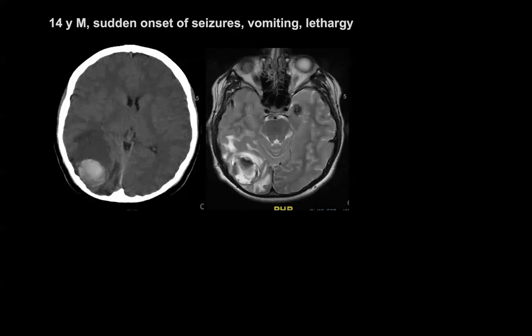Why is that and what should we do? Basically, there are two areas of susceptibility. One is a big hematoma. This is probably a cavernoma. So this should trigger some reasoning, and again, you should change your protocol accordingly.